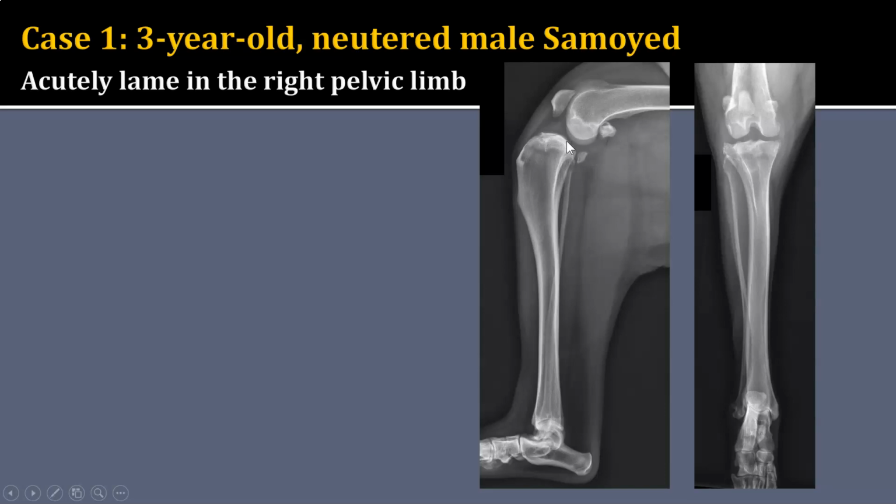So I'm looking at this intercondylar eminence of the tibia, and I'm seeing that instead of being in its normal position, which, remember, when we look at the femoral condyle, divide it roughly into thirds, that intercondylar eminence should be positioned in about the middle third. It is actually too cranial. So this is cranial location of the tibia relative to the femur. And so I have seen that there's a problem with alignment here.